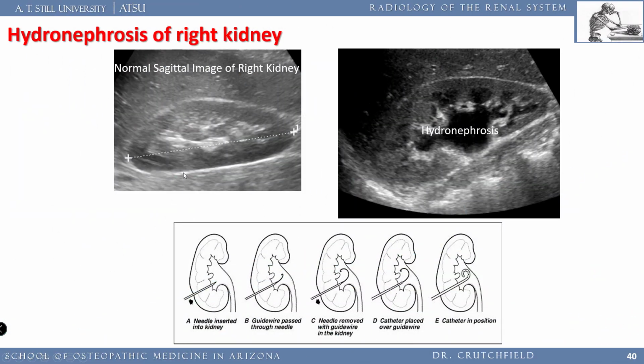So let's look at hydronephrosis of the right kidney. So here is an image of a kidney. Okay, and you can see the cortex. Here's the medulla of the kidney. Here's the renal cortex. And here's hydronephrosis. This is fluid inside the collecting system. Okay, this is not normal.